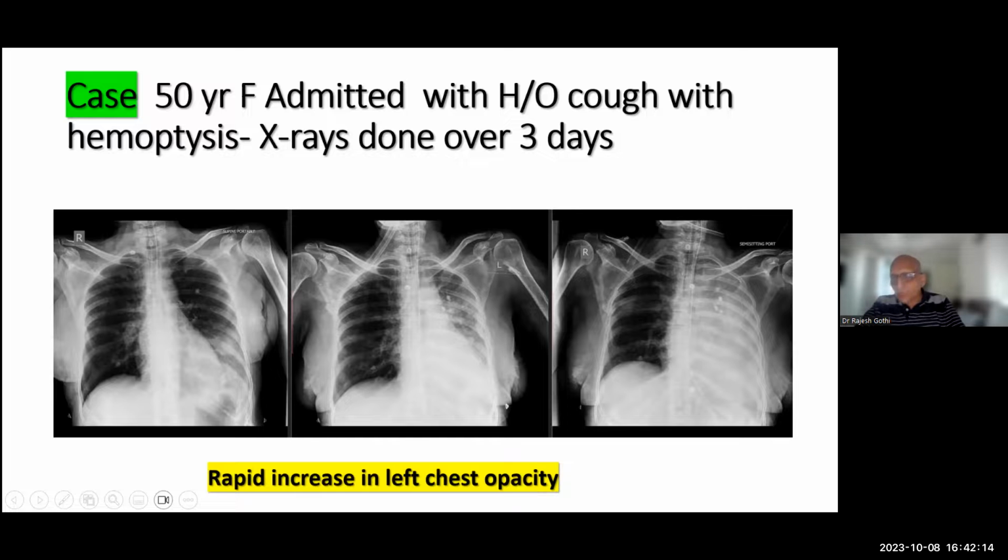Here, what we are seeing is opacified chest, opacified hemithorax. How do we know whether it is the lung which is opacified or the pleura which is opacified? The chest X-ray does not give us this inference. So you must use ultrasound, and it's a really wonderful investigation, which you should use as frequently as possible, and you will be rewarded by using ultrasound.